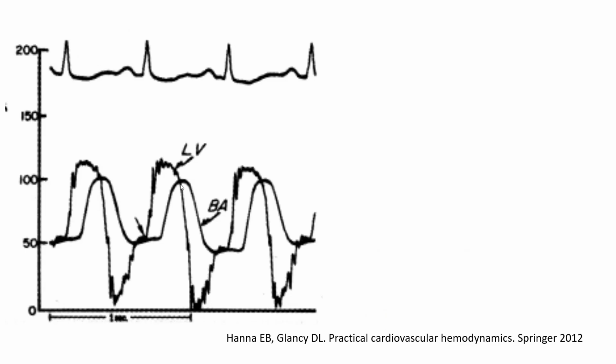Now, granted that also you have amplification of that arterial pressure, so the aortic pressure is somewhat lower. Still, nonetheless, I think AS is not severe here. It's probably mild. Because of the peripheral systolic amplification, you should typically never do simultaneous femoral or brachial or radial artery compared to LV, because it's hard to tell how much amplification you have. It's hard to compare.